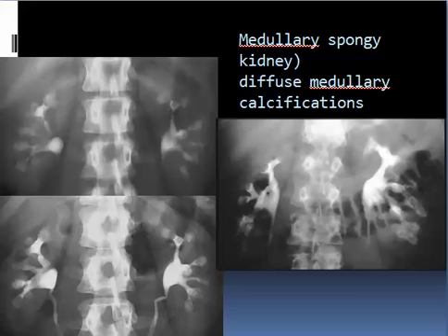those conditions that can be caused by prolonged compression on the kidneys. That means intravasation of contrast or reflux of contrast into the terminal renal tubules. This is called tubular backflow.